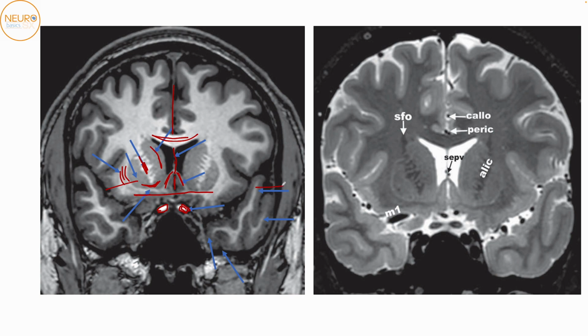This is the superior temporal gyrus and the middle temporal gyrus. This here is another important sulcus when it comes to the temporal lobe. This is known as the rhinal sulcus. The rhinal sulcus demarcates the entorhinal cortex over here, which is also a very important cortex. So this is the entorhinal cortex. You have the rhinal sulcus over here.